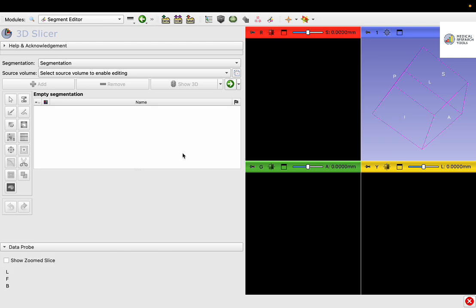After loading your cases, you can use each part to create a 3D structure based on your imaging, revise it and correct it to be perfectly matched to the exact part in the imaging data.